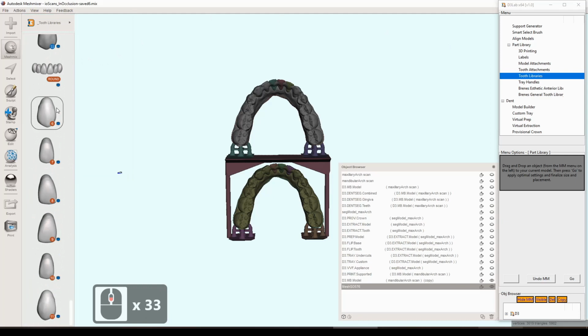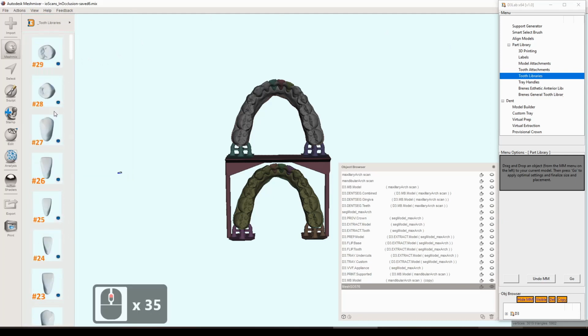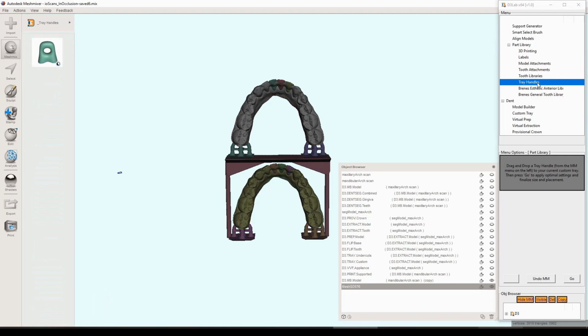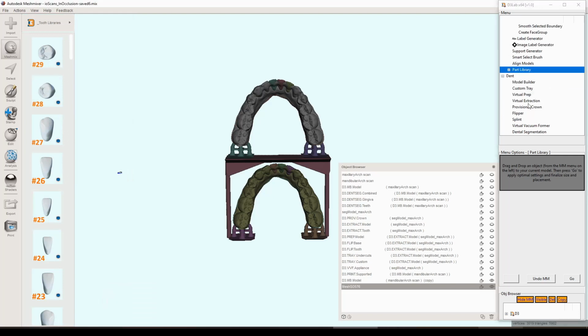Next one up here is the tooth libraries. It cannot be understated, Dr. Christian Brenes has made these several different libraries available to the public, freely distributable. It's an absolutely amazing thing what he's done, and it allows me to do what I've done because of that. Anyways, that will bring us to the end of this video and the end of this initial video series.